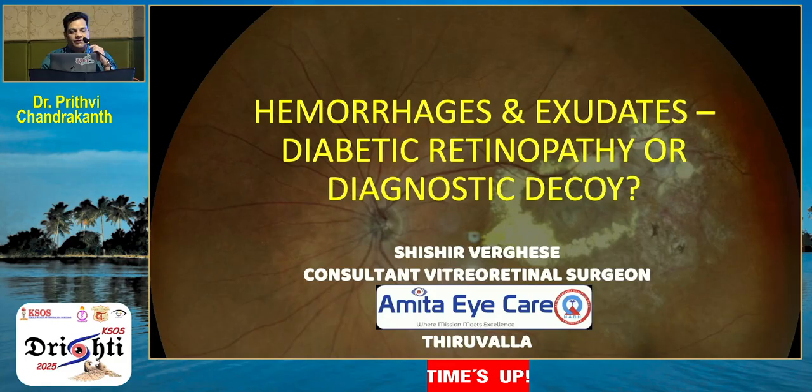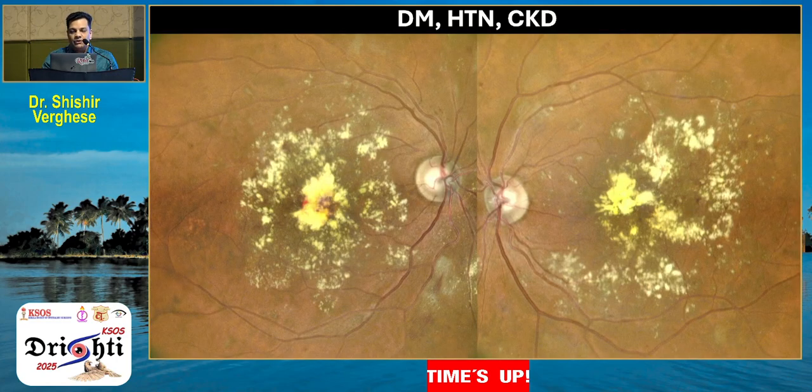So good morning, everyone. My talk is on mimickers of diabetic retinopathy. Sometimes when DR comes to your clinic, or some patients are referred to you as diabetic retinopathy for treatment, it's not exactly what it seems to be. So let's go on and see some cases.